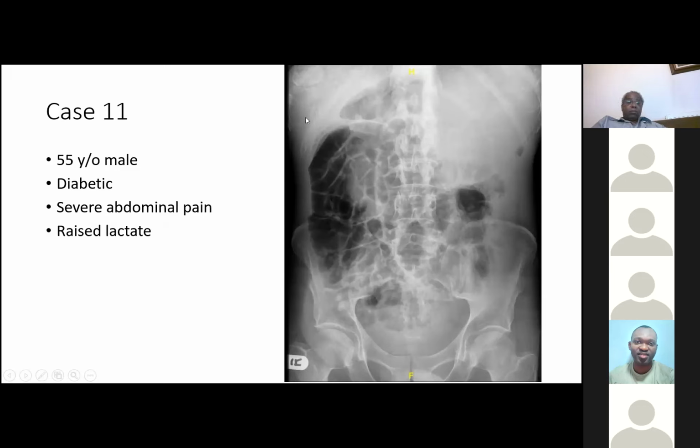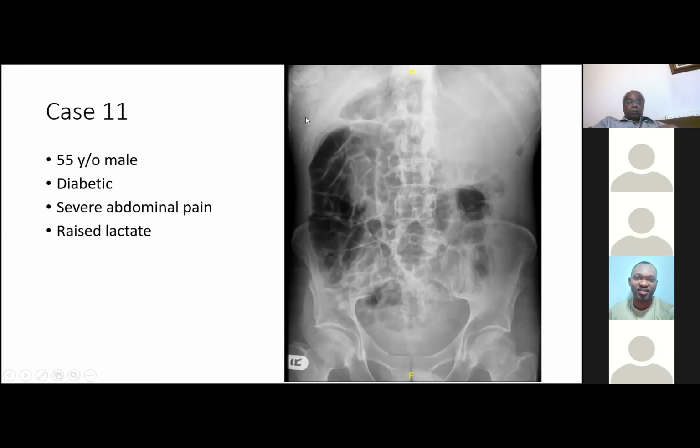This is actually a difficult spot. You probably need to magnify your image quite a lot to be able to see that very clearly. These days we rarely see it because in most of these scenarios, patients are going to get a CT scan, not a plain film. And by the time you see gas in the portal vein like that, it typically means the prognosis is quite poor. Although because we're scanning so many patients these days, it doesn't necessarily always mean a poor prognosis.